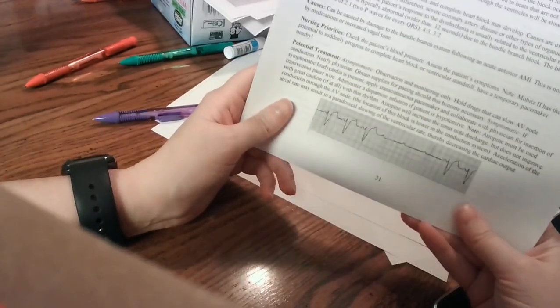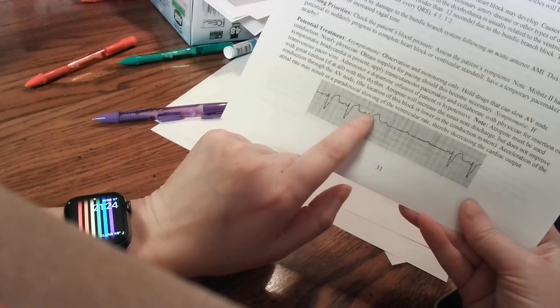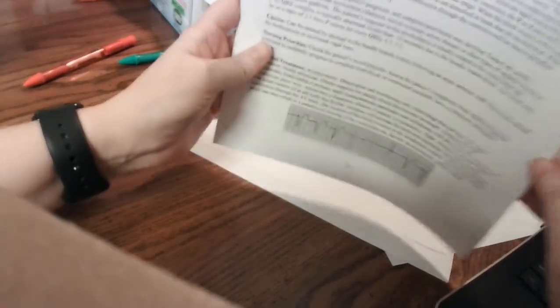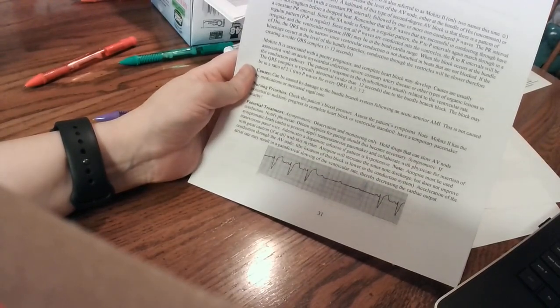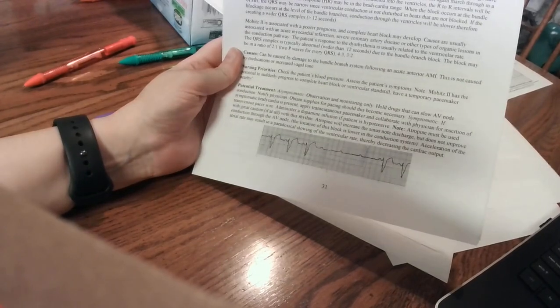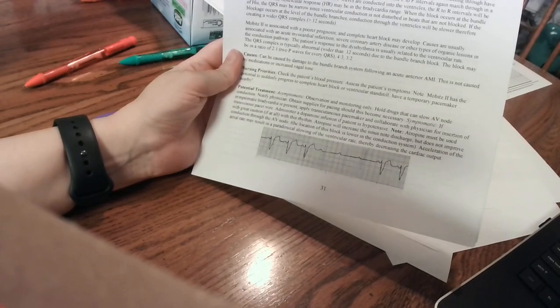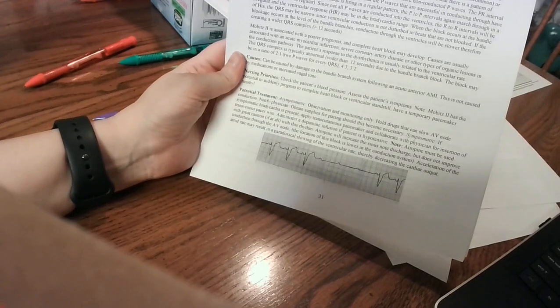The difference between this one and Wenckebach is that the PR interval is always the same when it actually fires into a QRS. Patients who have this are not always symptomatic, but a lot of times they are. And if they become symptomatic, a lot of times what they need is just a pacer to start pacing those extra beats that are missing.